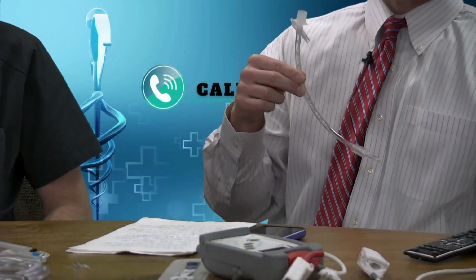That's okay. So I mentioned earlier that there are different categories of anesthesia. The deepest level of anesthesia we use is general anesthesia, which requires us to assist the breathing of the patient. And these two devices are what we use for that. This is what's called an endotracheal tube. I don't know if you can see it very well.